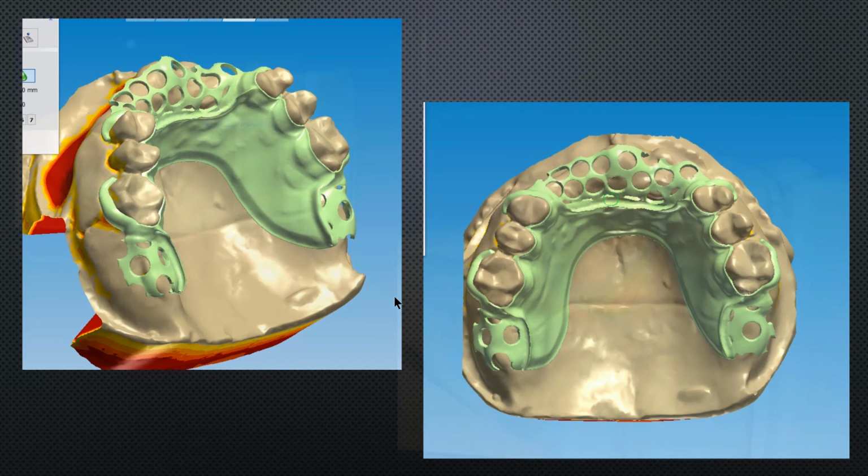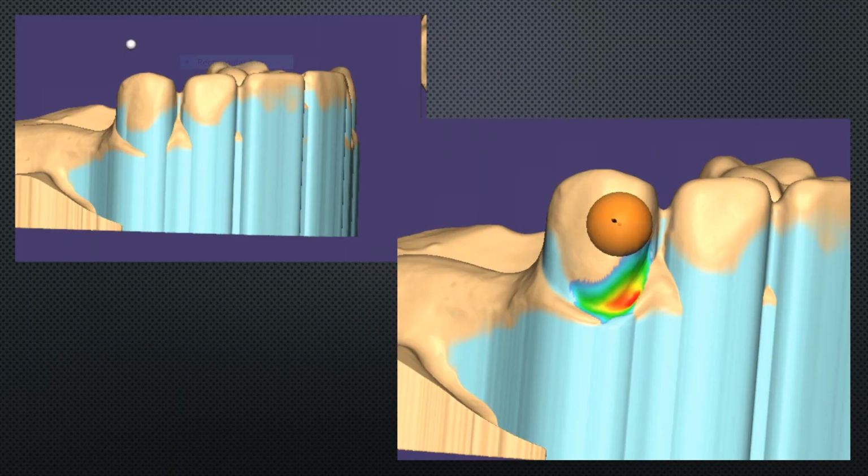All right, so jumping from the 3Shape over to Exocad. I just wanted to make sure that everyone had a good view of how to create these clasps with both different softwares, because I'm sure we have some people out there that have the Exocad as well. And so one of the differences here, Exocad's demonstration of the undercut is a little different, where the 3Shape was kind of going from a yellow to a red, transitioning through. Exocad goes from blue to kind of a green to yellow, orange to red, kind of this more gradual demonstration of the undercut. And so again, we want to stay above the undercut in this area because we're going to have acrylic in this area. And then we can go down into a nice deep undercut at the tip, middle to the tip of the clasp.